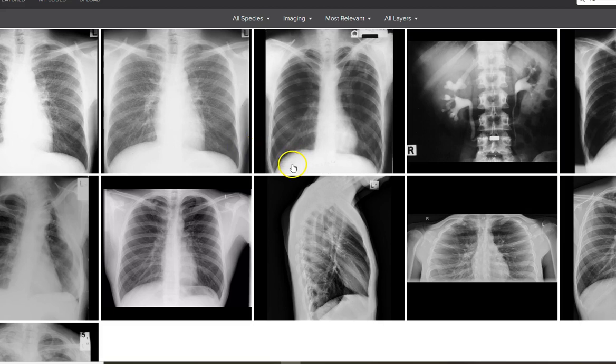Another thing you guys might have heard of as being a contraindication to treatment is TB. Just as a note of point, I was told when I was training many moons ago that I wouldn't see TB in my career, but that's definitely not been the case.